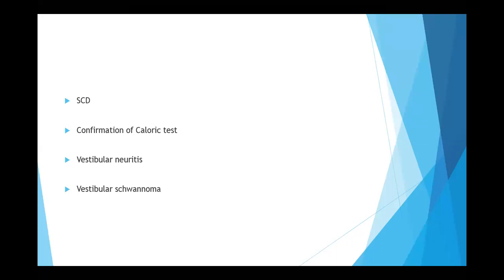If it's a single channel, then it doesn't allow us to change the filter settings. If it's a dual channel, then yes, very good. We can change the filter settings, because for OVEMP and CVEMP we need the filter settings to be changed when compared to the ABR, right? So we use the same ABR page.